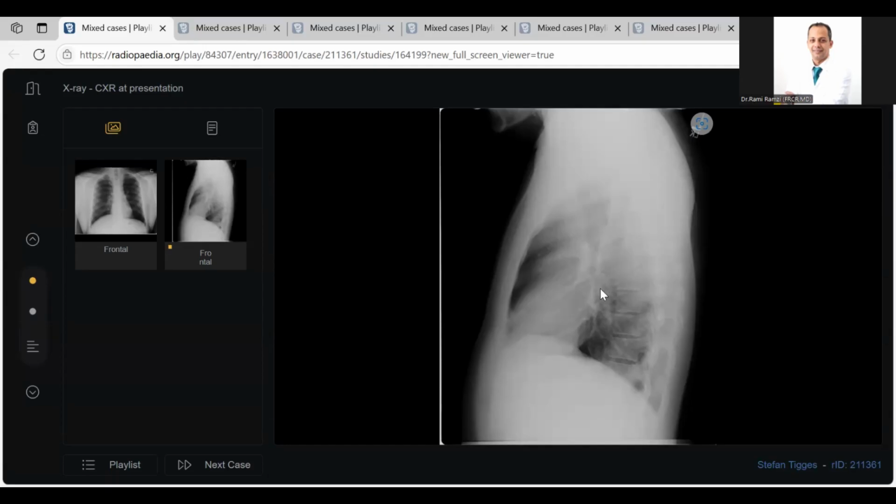It is a very difficult case, by the way. Don't worry, it's very difficult. See, loss of the more black sign. What you're trying to imply is that it's brighter, more opaque than it should be on this radiograph. Excellent. So what will you do next?